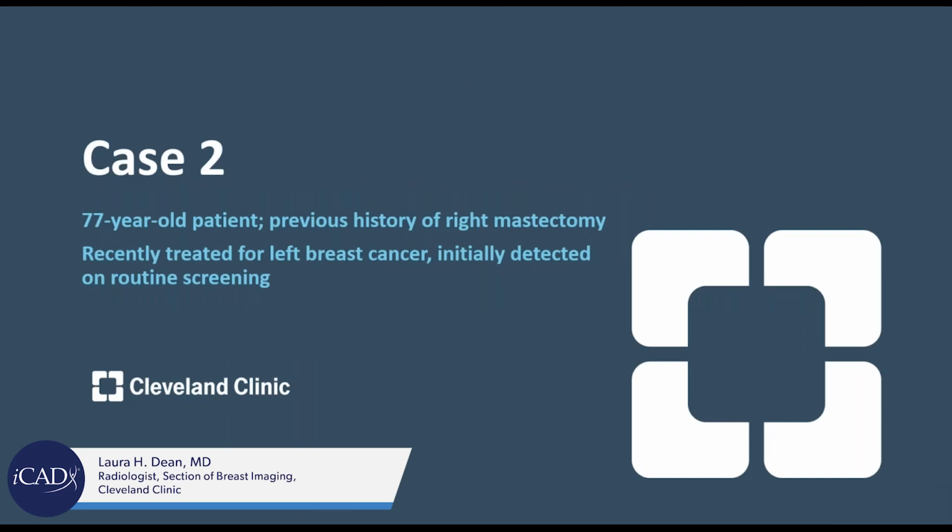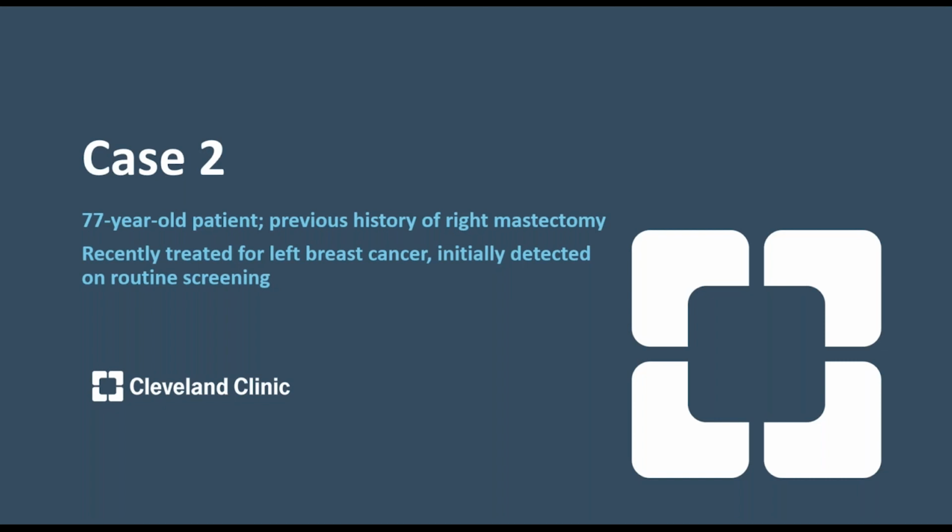So we'll move on to case 2. This one is a little bit different. This is an older patient, a 77-year-old lady who had had a previous mastectomy, so a cancer on the right. She had recently been treated for a left breast cancer. What I'm initially going to show you are the images from her post-treatment mammogram.